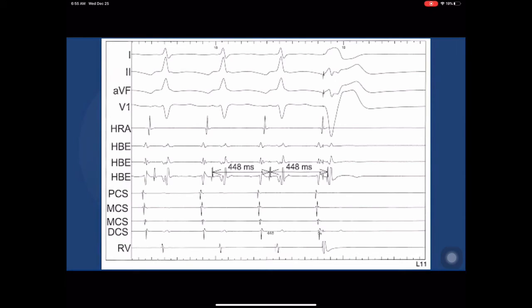So during this long RP tachycardia coming up in the septum, and I have to tell you, I don't have the rest of this case to show you, but this was a very difficult patient because this patient also had AV node reentry with a long RP. And sometimes we thought it was the AV node reentry, and then suddenly on another run in the lab, we had this tachycardia, so we went in and put the PVCs, and it was that, oh my God moment, I know what I'm dealing with.